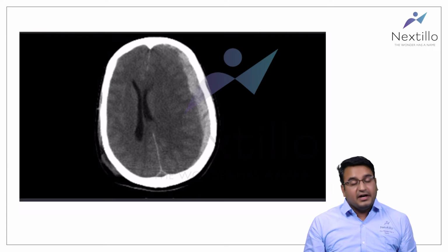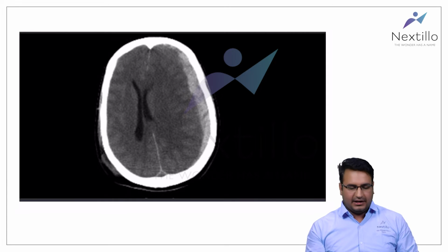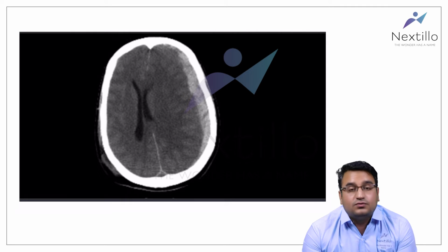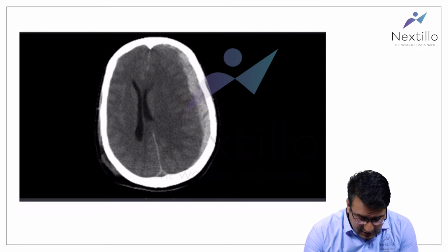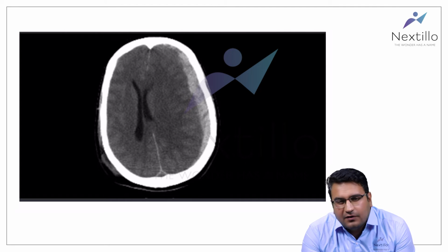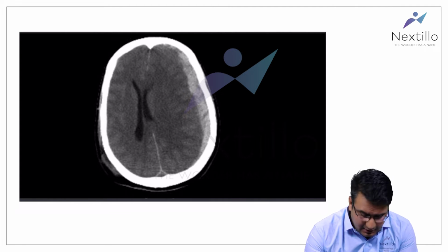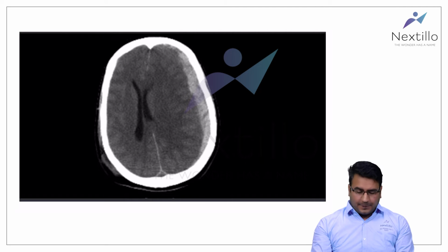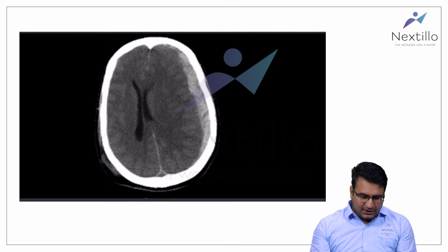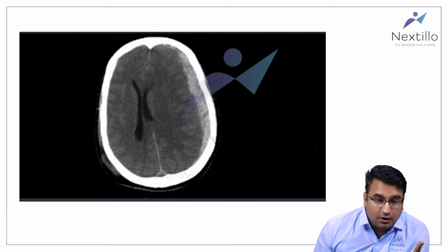Now we have completed the extradural hemorrhage. Now let's come to the second type. Have a look at the image. This is what you are going to get in your examinations. They are going to give you this, and generally the history provided is that there is no history of trauma associated or something like that. Just have a look. What you are able to see is a concave shape.